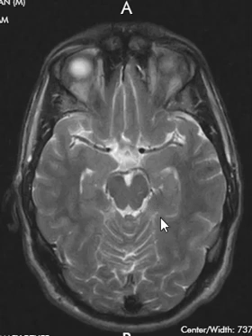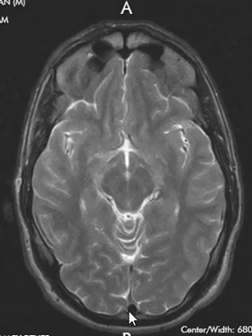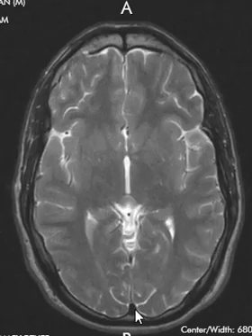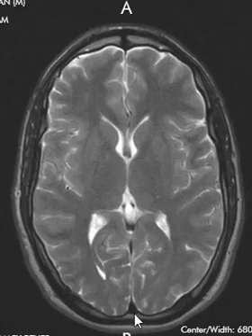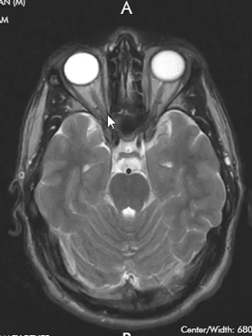In the very, very back, there's also a dural venous sinus here. So this is a venous channel where the blood returns through here. And we look here, is that a nice dark area, or is there abnormal brightness? But it looks like nice, dark, flowing blood within that dural venous sinus. So that looks very, very good. Again, the eyes look good.